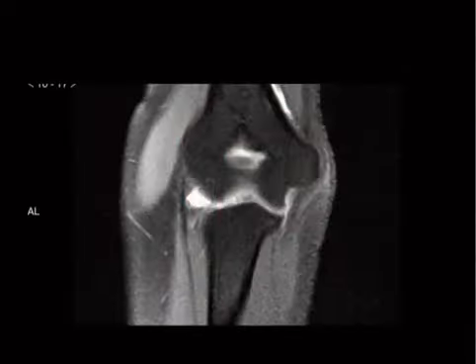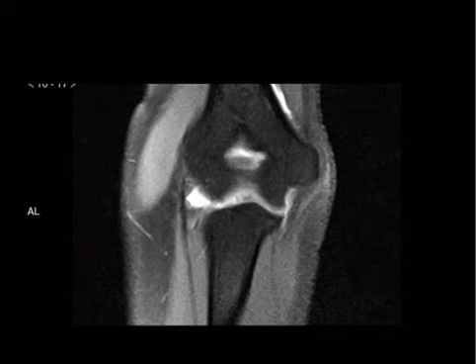This is probably the most likely thing to be shown, because I remember as a resident that whenever they showed an elbow case in case conference, this was the only thing that I knew, and I would always get the case right because this was the only elbow case there was. So that right there is supposed to look like a T. See that? So this is the ulna. We're looking at the ulna here, by the way. All right. See, look how far. Here's the olecranon fossa. Right. So we're in the ulna to cut through, and we're seeing this signal here. They'll often do gadolinium arthrograms to look for this.